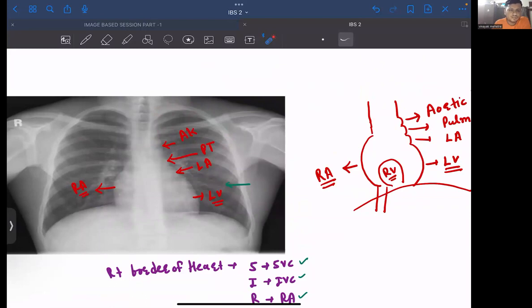How you will remember? The rib which you are seeing... Okay, अभी confusion हो गया ना? जो पहले दिख रहा है सबसे बड़ा, that rib is actually second rib. So यहाँ पे देखो, कहाँ से गिनोगे तुम? First, second, third, fourth. 4 plus 1. So actually it was fifth rib. Right? Confusion दूर हो गया. This question has been asked in your exam hall. Right?